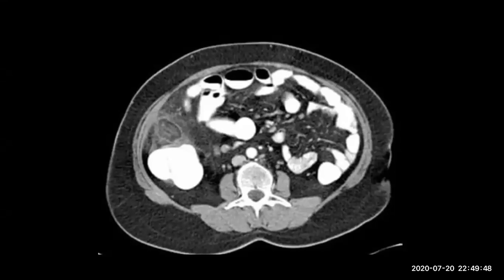This is one, hyperdensity, fat density. This is the hyperattenuated ring sign. This is one of the signs. Okay. The other sign. Central dense, yes. Dense vessel visible inside it. Dot or line sign.